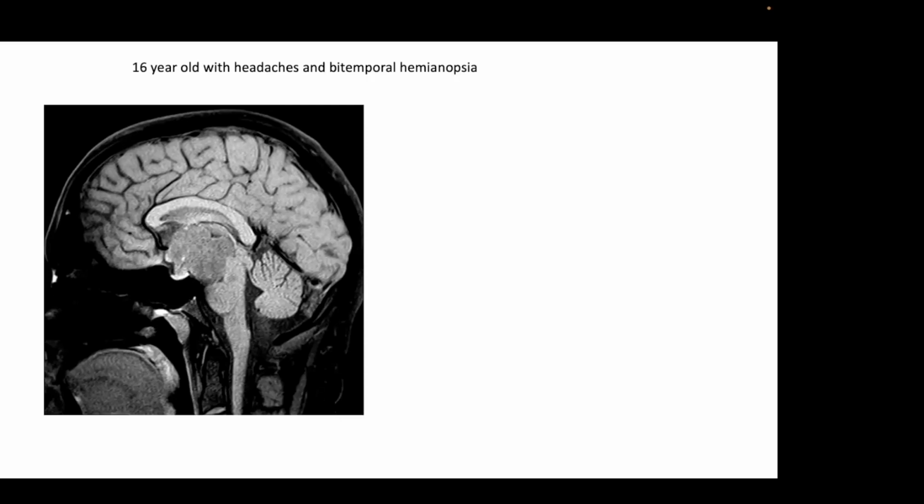Okay, so I want to make this point: if you're dealing with things that are in the sella and in the suprasellar space, you want to look to see if you can find the pituitary gland. Because all pituitary tumors, these giant adenomas, the macroadenomas, will be arising from within the pituitary gland, and you cannot find a normal pituitary in those cases. So if you can see a pituitary gland, and this looks like the pituitary in the inferior portion of the sella, then you need to move away from the concept it's of pituitary origin.